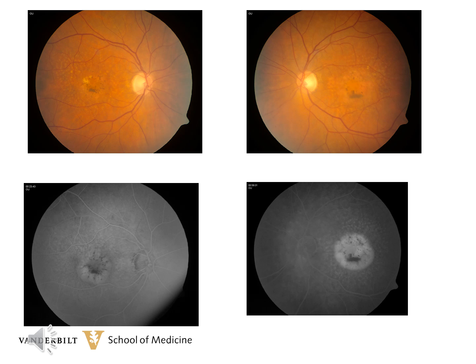This patient has bilateral pigment epithelial detachments. These detachments will sometimes have pigment migration on their surface, and sometimes it'll have what is called a hot cross bun look to the pigment. As with any pigment, it will block any dye posterior to it.